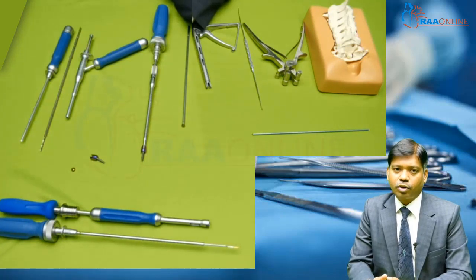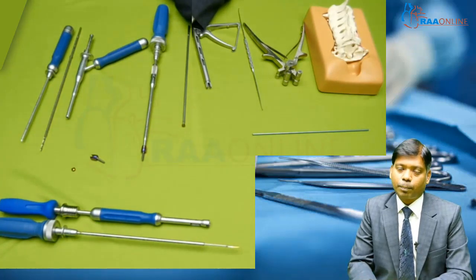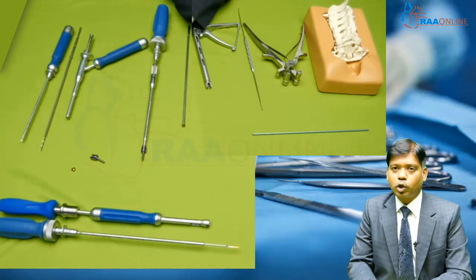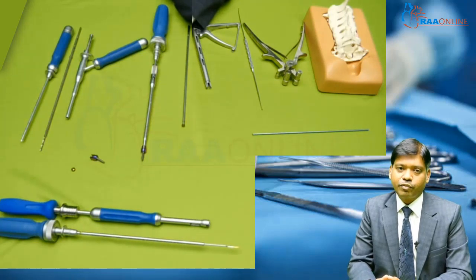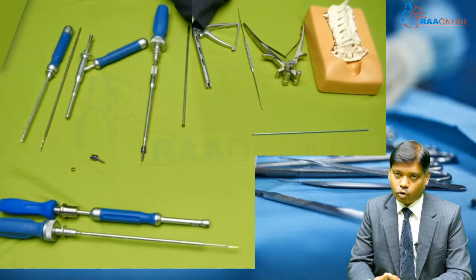So the implants or instruments which we use are cervical lateral mass screws. In the thoracolumbar region we saw pedicle screws, but here we use lateral mass screws, because they are relatively safer compared to pedicle screws in the cervical spine. If a pedicle screw goes medially, it will hit the spinal cord and can result in profound neurological deficit, whereas if it goes slightly laterally, it can hit the vertebral artery, and if it is a dominant vertebral artery, it can result in stroke and a major neurological deficit.